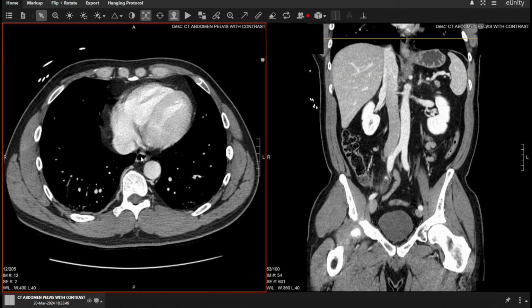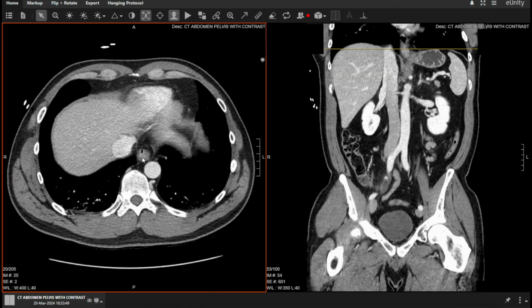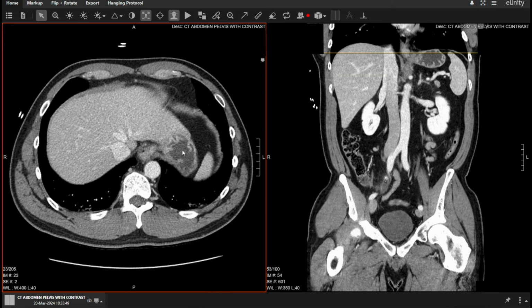Now, going back to the mediastinum, you'll see a bit of air here, so black is air. Anything denser gets more light, and you'll notice that the bone, which is white, is particularly dense, so that is much brighter than our lungs, which are full of air and are very dark. We have an air-filled structure here in the chest. That's the esophagus, and we can follow that down and see that the esophagus dumps off here into the stomach.